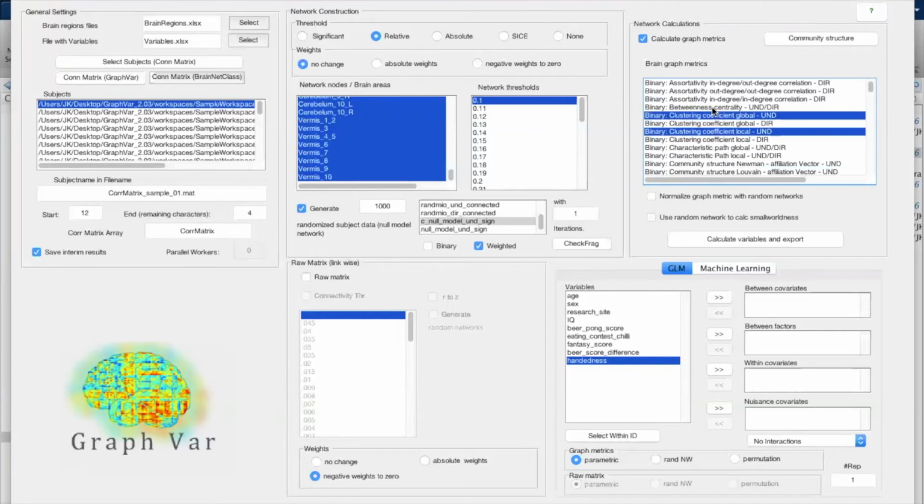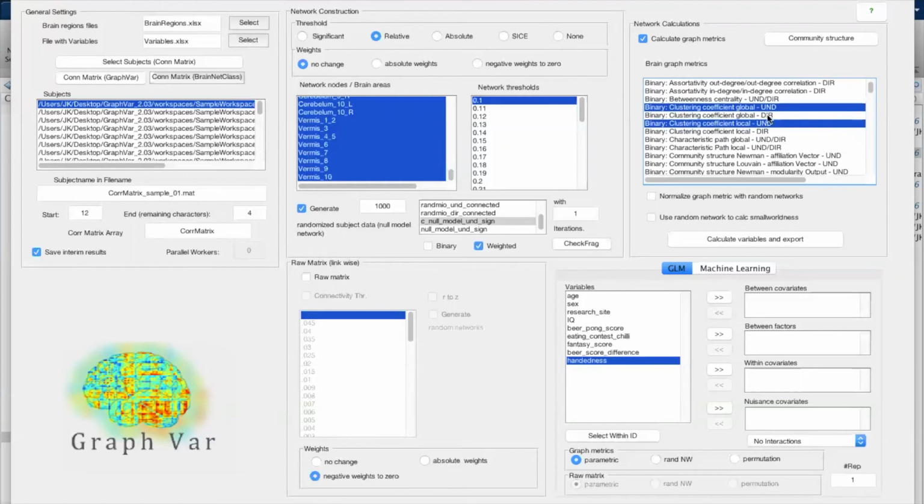And this makes sense because the results viewer is also ordered in such a way that we have a different visualization for graph metrics, either one-dimensional, two-dimensional, or three-dimensional. That's how we call it. You can also read this in the manual. If you have now selected the graph theoretic metrics that you want to analyze, you have the possibility of using those two options at the end here.